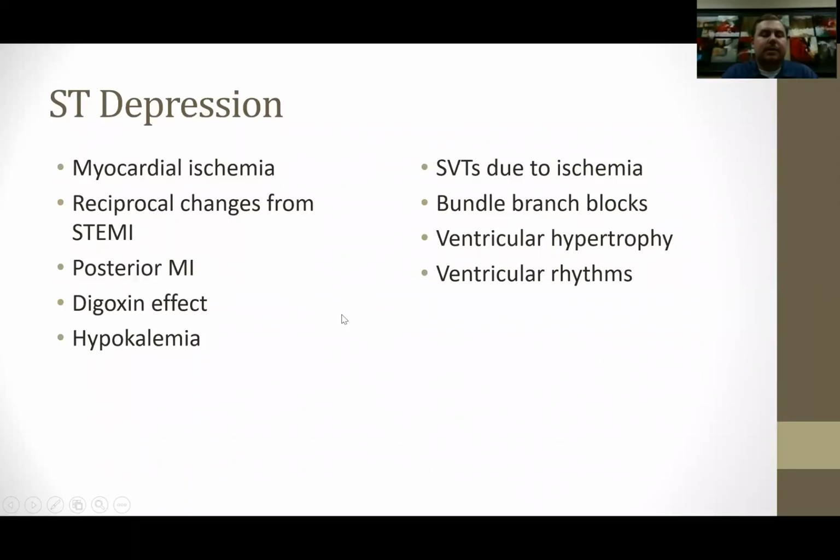Digoxin causes these little hockey stick type ST depression. It kind of looks like a hockey stick if I was a better artist. That doesn't mean they're digitoxic. That's just a common effect with digoxin.